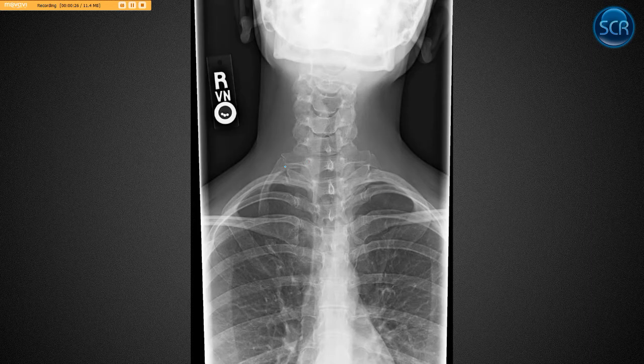Just another case. This one's quite a bit more well-formed, almost looks like a first rib. And then we've got a little riblet over here on the other side. Okay, and so again, these are horizontal. T1's transverse processes are pointing up.